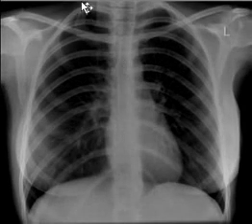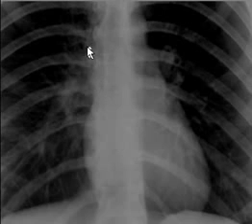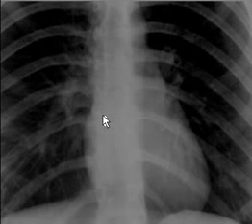Let me zoom it. Okay. So right main bronchus and left main bronchus here, they've got a mutual angle of less than 90 degrees at the bifurcation of the trachea, to suggest that there is no mass or enlarged subcarinal lymph nodes. We have ruled out cardiomegaly already.